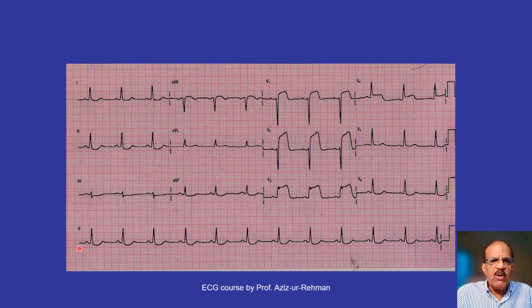All right. So once you have ensured that, then you scan the ECG in a particular sequence, lead 1, 2, 3, AVR, AVL, AVF, V1, V2, V3, V4, V5, V6. Now, if you're experienced, then of course abnormality would immediately attract your attention.